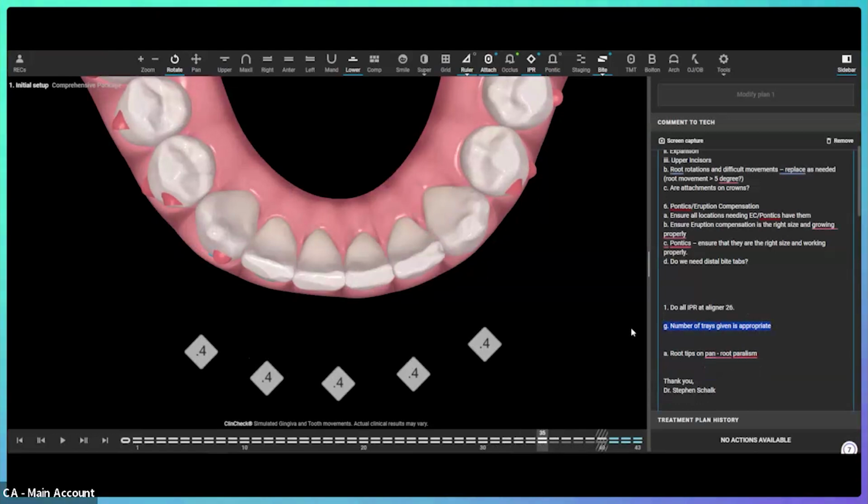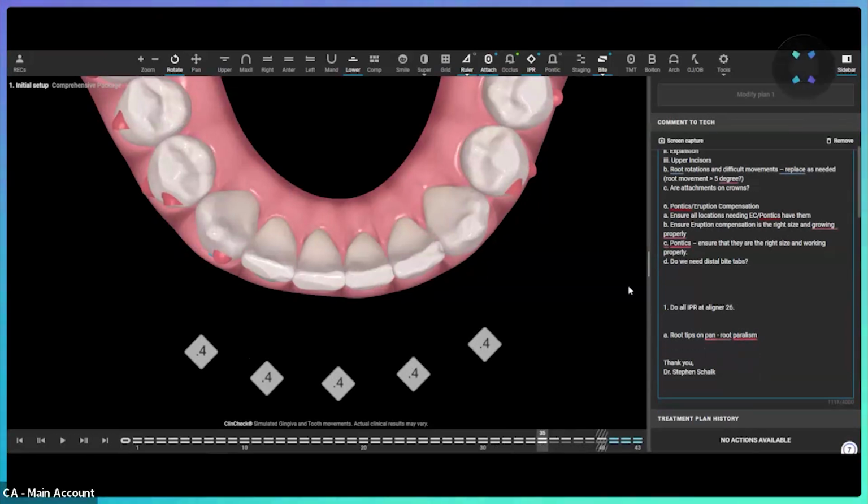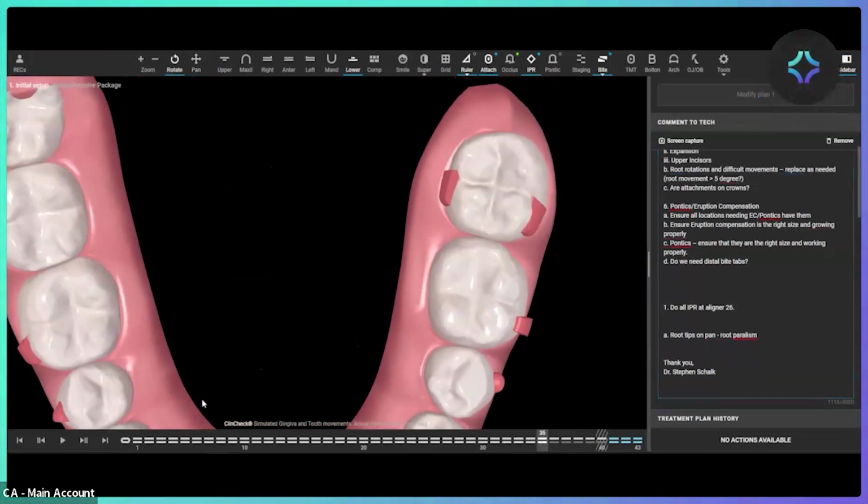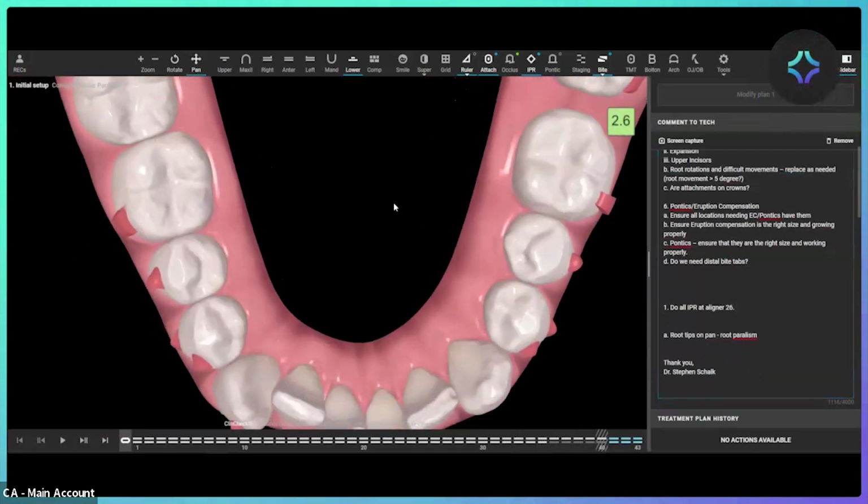So that's what, like 7 times 8 is 28. So we're looking at like 7 months. Or 7 times 4, sorry, is 28. So we're looking at about 7 months. I think that's fine for this initial movement, but what you're going to see is it's not actually enough for the molar movement. But we'll come to that in a minute.